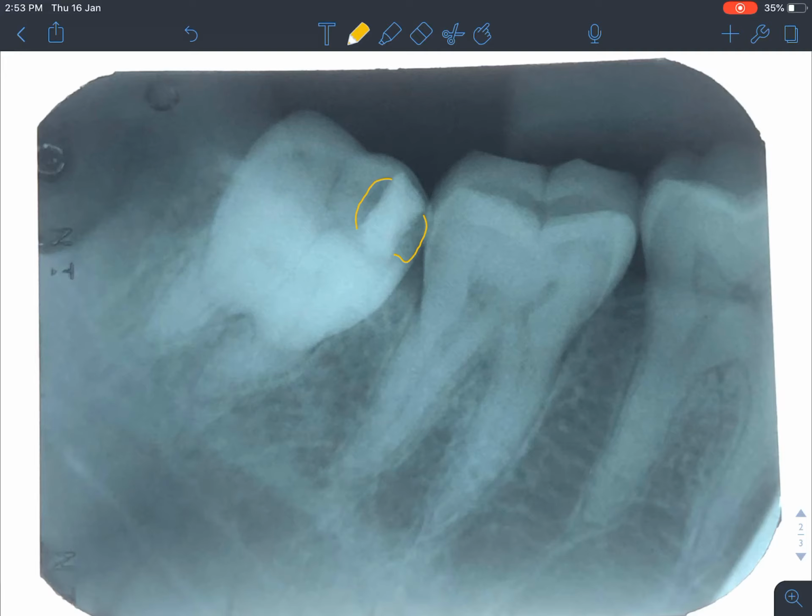So, is there anything left that we need to diagnose in this radiograph? Is this a secondary caries? Yes, it is secondary caries. Very good. That's an important question. So, based on this radiograph, it's difficult to tell whether it's residual caries or secondary caries. You might have to refer back to the history of the patient. Okay. So, that's about it. Thank you.